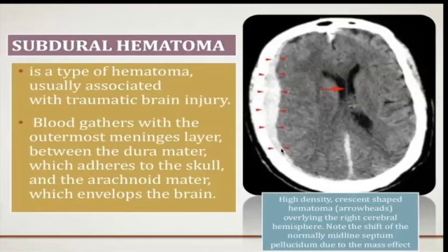And because we're speaking about veins, it means this collection is slow. So this is why you would see a lot of patients who have had several subdural hematomas and have never presented to an emergency department, especially if they are old. And this is why it's very common for us to see what we call a chronic subdural hematoma, and I'll be showing you an image of that shortly.